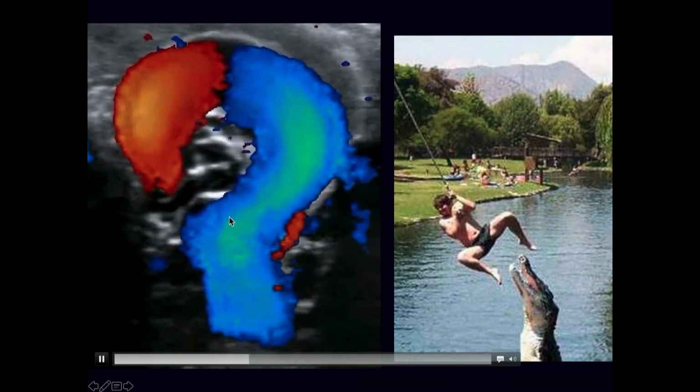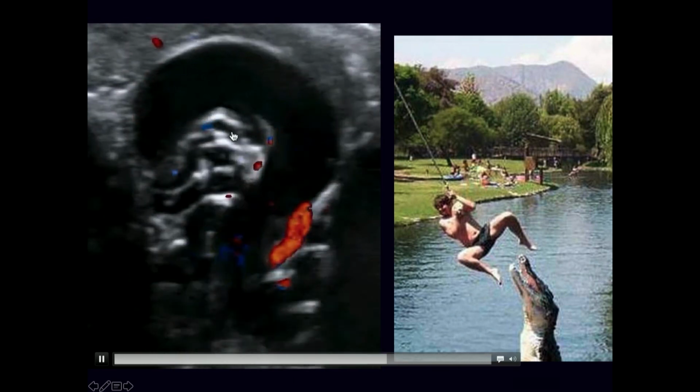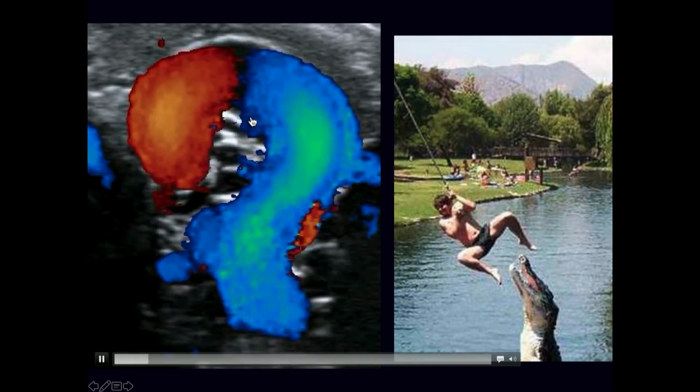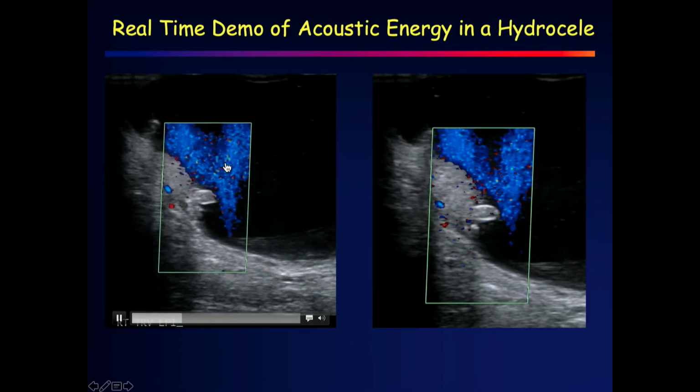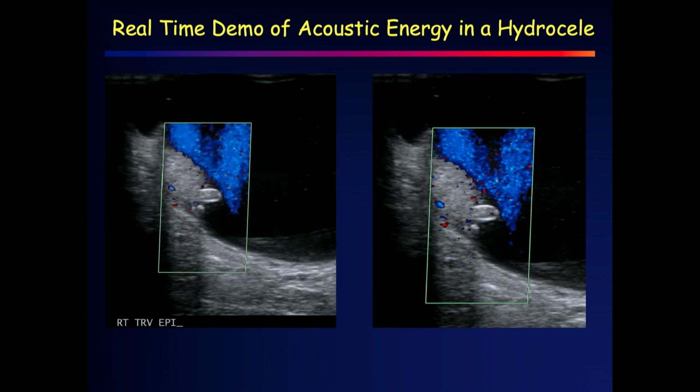Love this varicocele. We'll have questions in the other sections, but this is just perfect introduction for questions there. And then look at this little heart. This just shows the acoustic energy from ultrasound transmission in a hydrocele there.